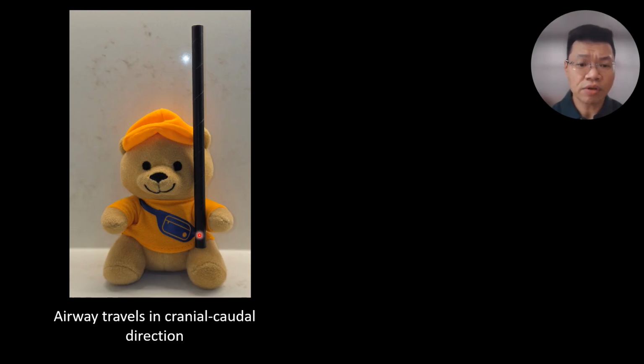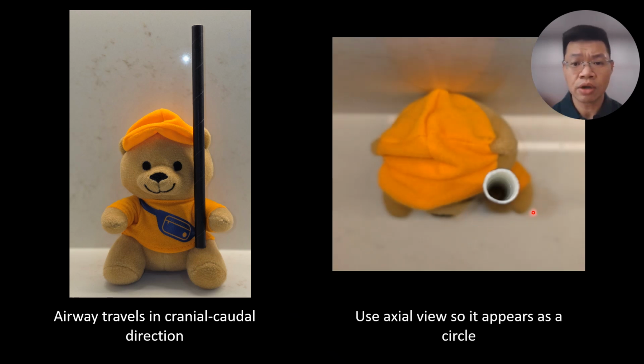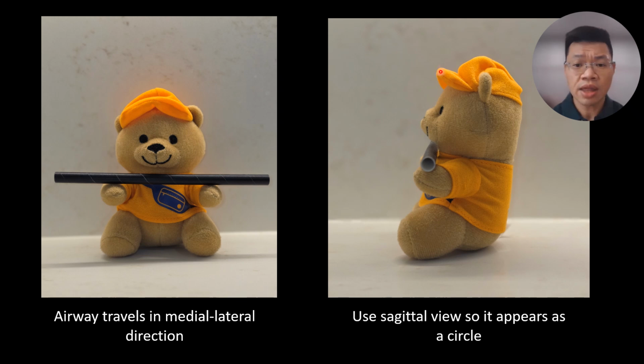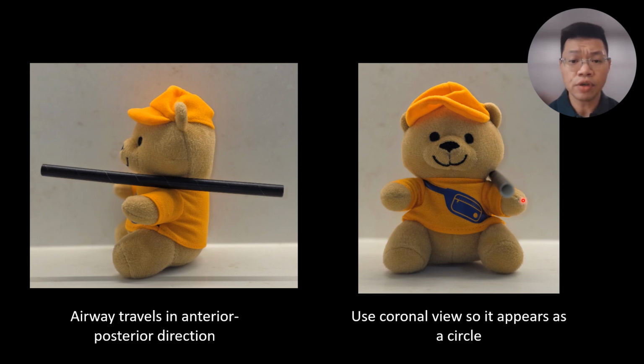If the airway travels in a cranial to caudal direction, as shown by the straw, if we were to section it this way, and to use the axial view, you will then view it as a circle. If the airway travels in a medial to lateral direction, using the sagittal view will allow you to see it as a circle. And finally, if the airway travels in an anterior to posterior direction, using the coronal view will help you to see it as a circle.